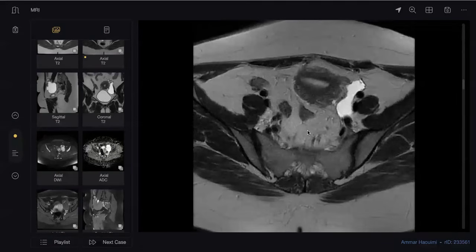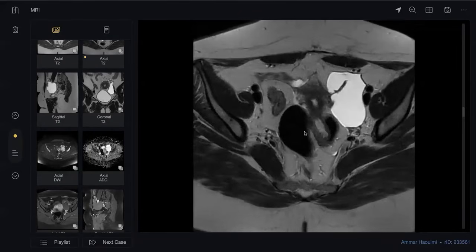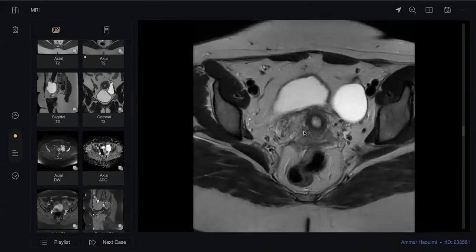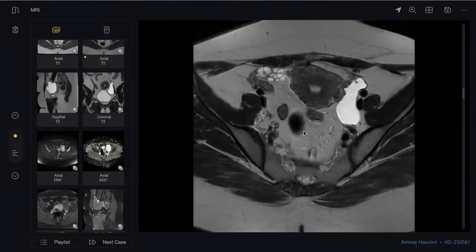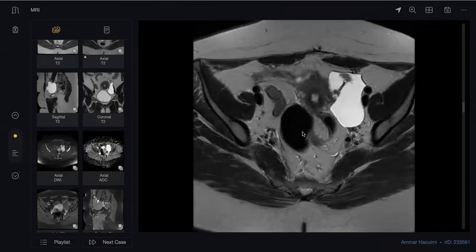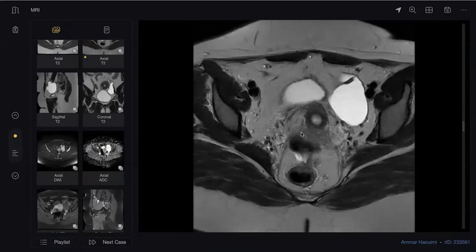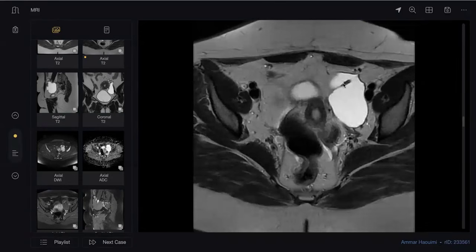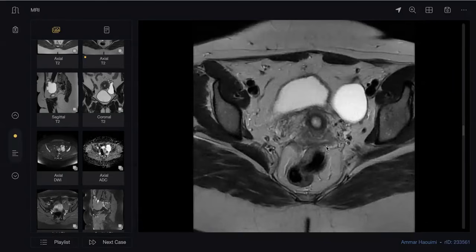Because there is a history of C-section, endometrioma, endometriosis, hemorrhagic cyst, these are the possible causes of the pelvic pain. So such a large fluid collection is there. Can it not be the cause of this pain in the abdomen? Yes, this could be the cause of pain.